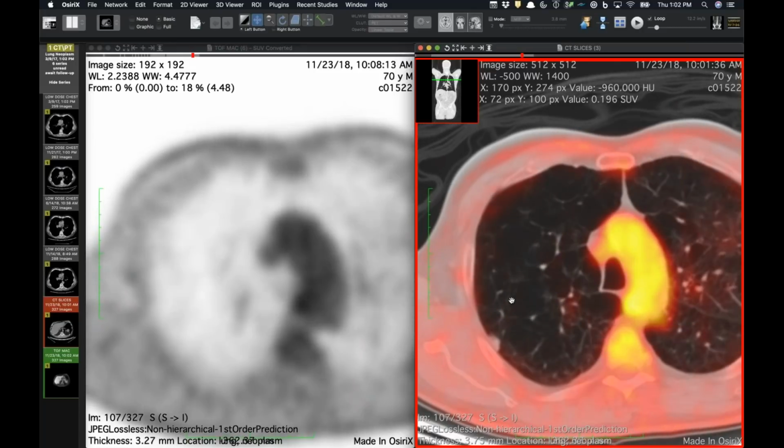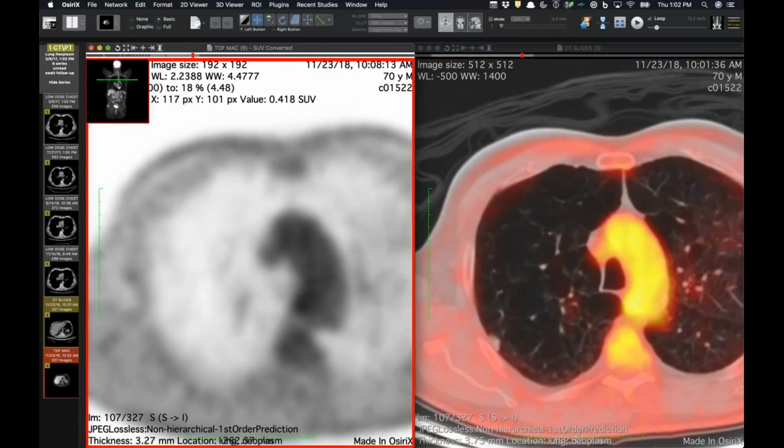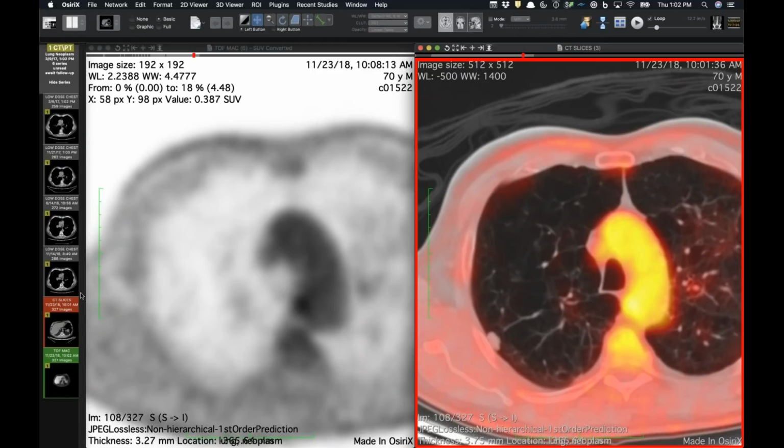We had a similar case, I was just reminded, here just recently that was taken out and ended up being a hamartoma. It was growing, but really not FDG avid. Yeah, and certainly we've had our share of hamartomas that grow. This just seemed to be pretty rapid growth. It's also not a very good shape for a hamartoma, though. Hamartomas are usually nice and spherical, and this one is not.